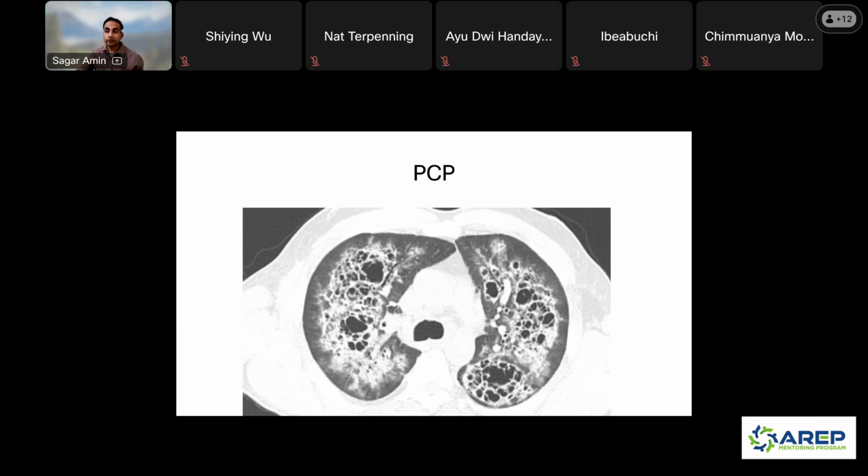So usually, if you have a patient who has HIV/AIDS, they'll have this central ground glass look with a few cysts here and there. This is just a very profound appearance. So I thought, you don't see this with anything else. And maybe you all have seen something similar looking where you're from, but in the US, usually if it's HIV/AIDS patients and they have this with the cystic changes, you always think of PCP as the diagnosis.